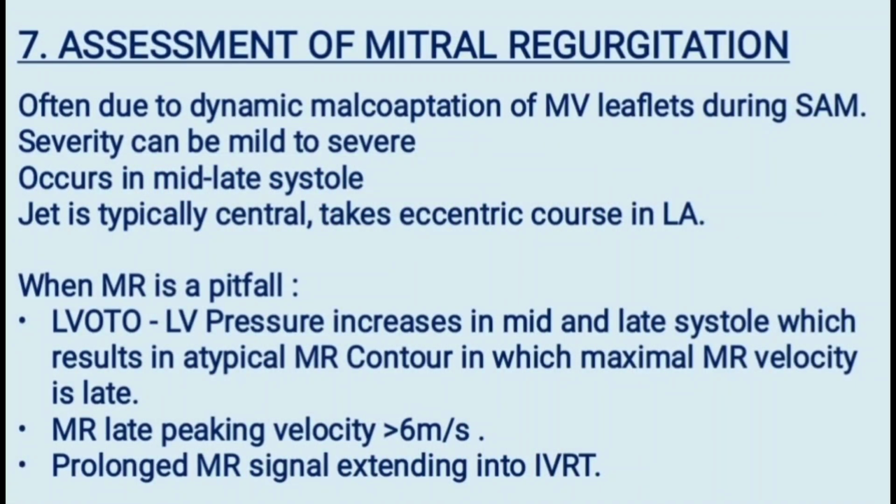Last and one of the most important parameters is the assessment of mitral regurgitation. The mitral valve is anatomically and functionally abnormal in the majority of patients with HCM. Anatomically, the leaflets are larger than in normal people. Functionally, MR results from SAM of the leaflets into the LVOT, leading to late systolic failure of coaptation and, as a consequence, a posteriorly directed MR jet. MR severity typically is moderate but ranges from mild to severe and varies dynamically with the severity of outflow obstruction.